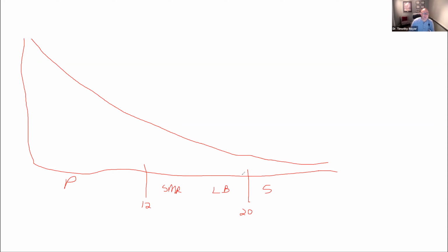So when we're thinking about different disorders, we want to see what are the distributions across these different bandwidths. So let's first start with anxiety, okay? So the ideal slope is the red line, okay? If I saw a slope that looked like this yellow line, okay, I would know two things from a biomarker, okay?